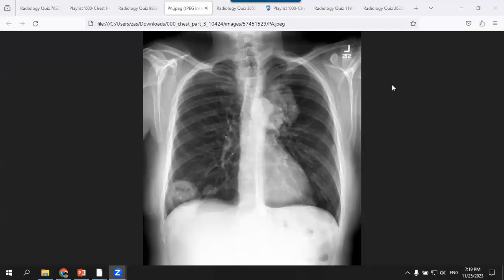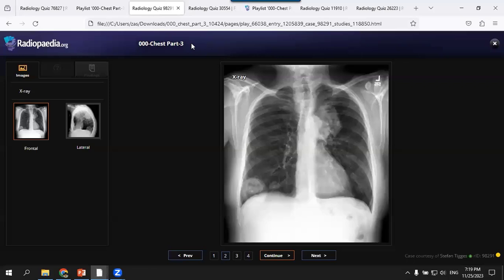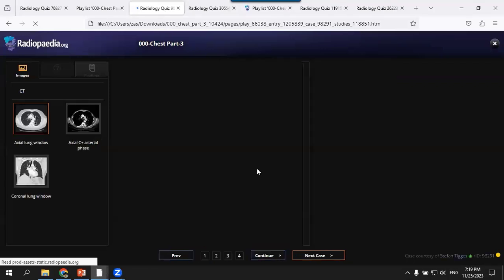So I would do CT of the chest for better evaluation. As you said, one of the possibilities is cavitating metastasis. No extra soft tissue in the neck, no surgical clips of the neck. Just comment on this during description, because the clue may be in the neck.